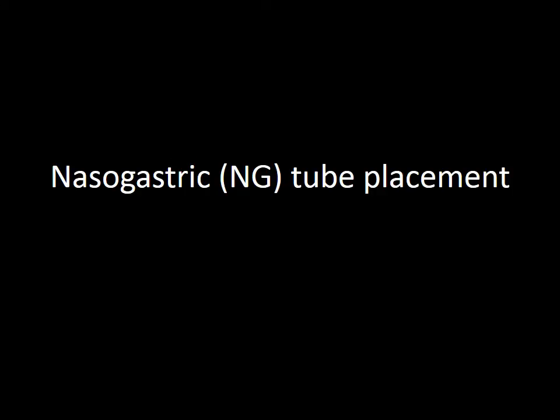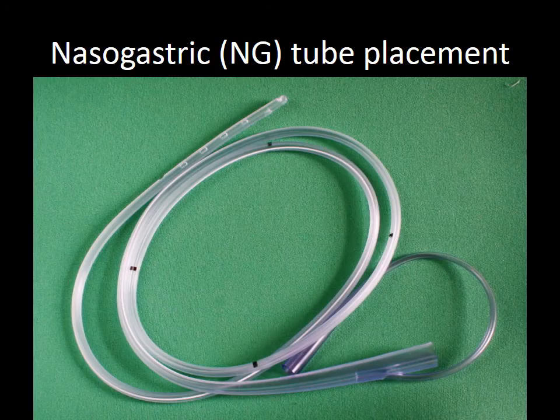Nasogastric tube placement. Nasogastric tube positioning should normally be confirmed by a trained specialist registrar or above. However, a study in the UK, published during 2014, found that 1 in 5 nasogastric tubes are misplaced above the stomach. This increases the chances of an aspiration pneumonia occurring.